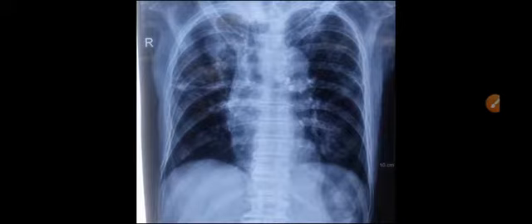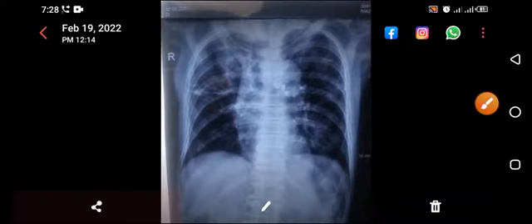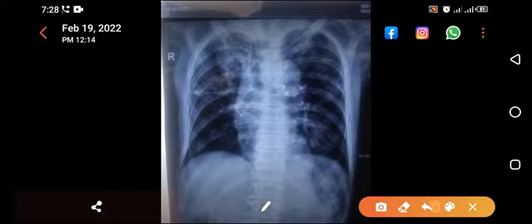Well, today we are going to discuss another very important chest X-ray. Till now, we have covered almost 9 to 10 chest X-rays with complete explanation and diagnosis. Now, in this X-ray, we will apply the RIPE criteria discussed in previous lectures. So, what do you see over here? First thing is rotation, inspiration, penetration, and exposure, already discussed in my previous X-ray. But I will go directly to the finding.